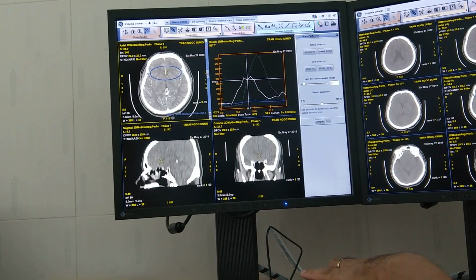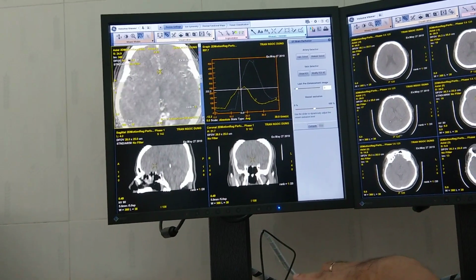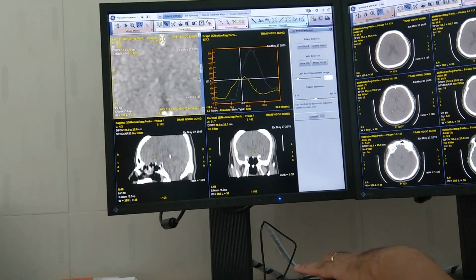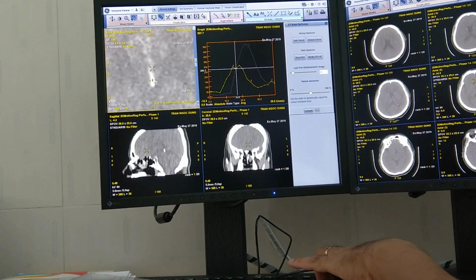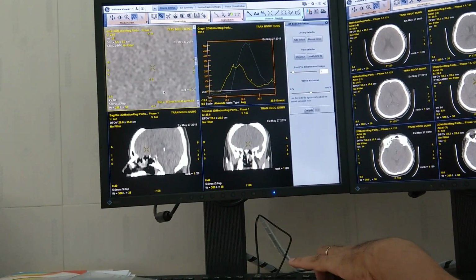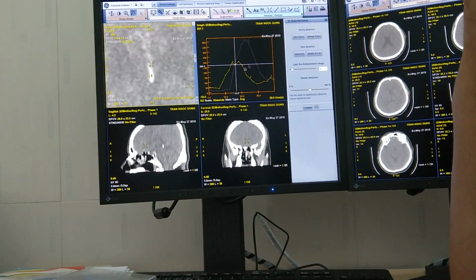Mình đặt điểm không được thì mình đặt lại điểm động mạch khác. Ví dụ như động mạch kia anh không thích, anh muốn đổi động mạch, mình sẽ put here small. So and then I check. Okay. Alright. So I say I want this one.